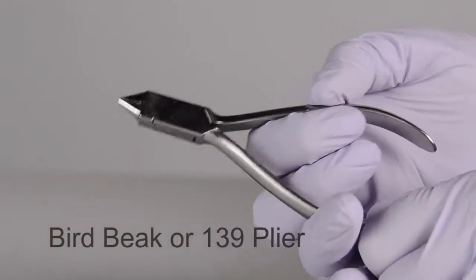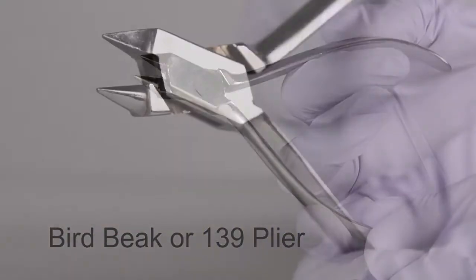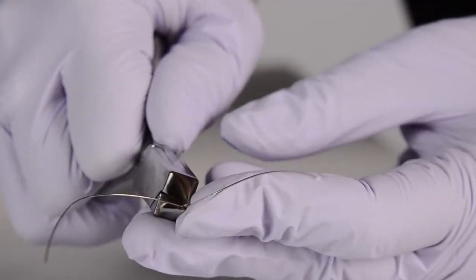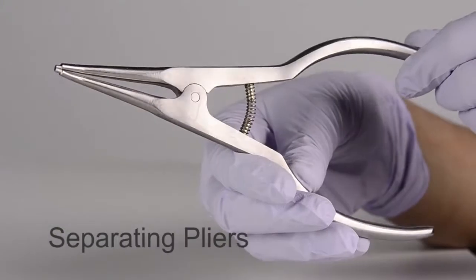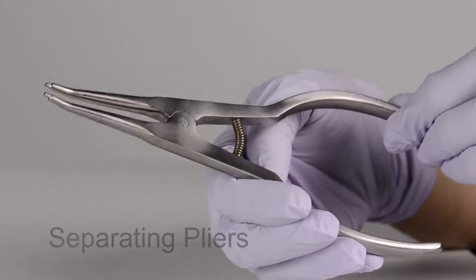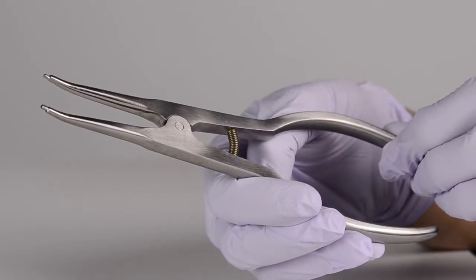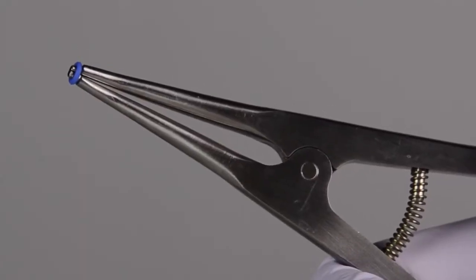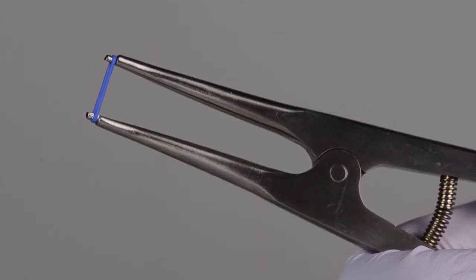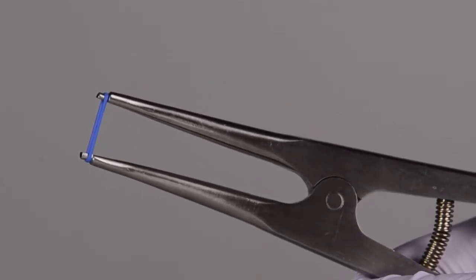The bird beak, or 139 plier, has pyramidal and conical beaks used for making bends in orthodontic wires. Separating pliers are reverse action pliers with tips at the end to hold the separating modules. Separators are placed on the ends of the pliers, and the handles are then squeezed together to stretch the separators for placement on the teeth.